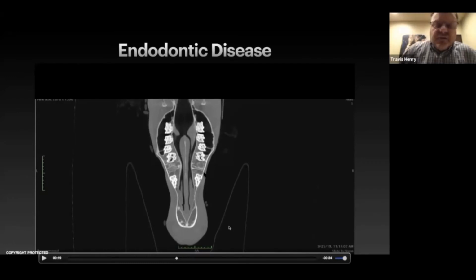Remember, only 11% of the infundibula will be normal. So we're going to find a lot of gas and openings in infundibula. And the trick is figuring out, is the apex in trouble? Is that breaching through to a pulp horn? And so forth. So CT is really, in my opinion, probably the only good way to evaluate whether an infundibular caries is causing your problem.